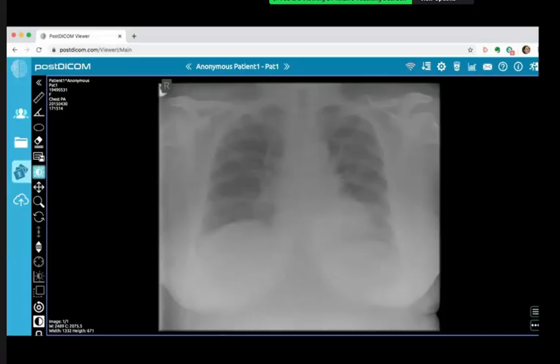I'm just getting very blurred images, unfortunately, on my end. It's going on and off in terms of reticular patterns. I think there are fairly prominent upper lobe reticulation, I think. And I see some possible surgical clips on the left side projected over the mid-zone. Perfect. Those were the breast surgery clips. She had a wide local excision.